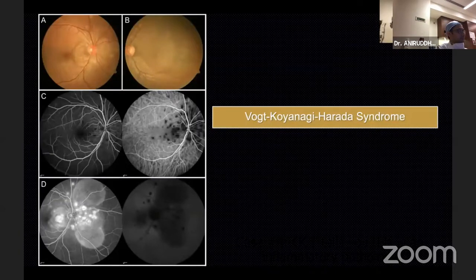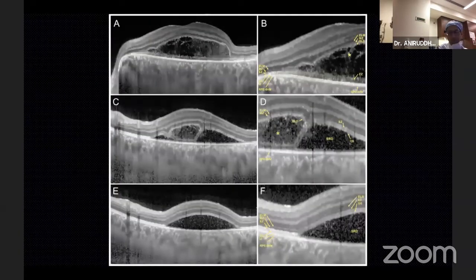serous retinal detachment. Now, when you do an OCT, and this is a recent description from our group, these patients have what is called the bacillary layer detachment. Essentially, if you focus on image B, the arrow, which is termed BLD, is the bacillary layer. It simply indicates a split in the myoid zone of photoreceptors. And as you can see at the bottom of this hyporeflective space, you have the ellipsoid zone, which is relatively intact. This has been termed the bacillary layer detachment.